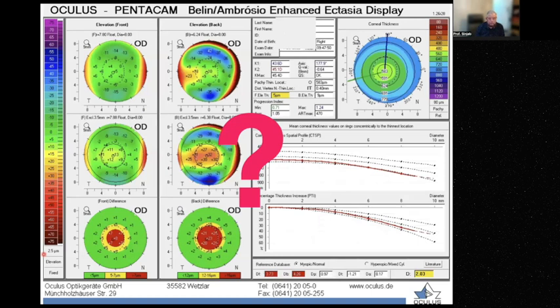Is that true? Who can say what's wrong with this map? We cannot depend on this map. Why? There was a mistake. Who can say? Can you hear me?